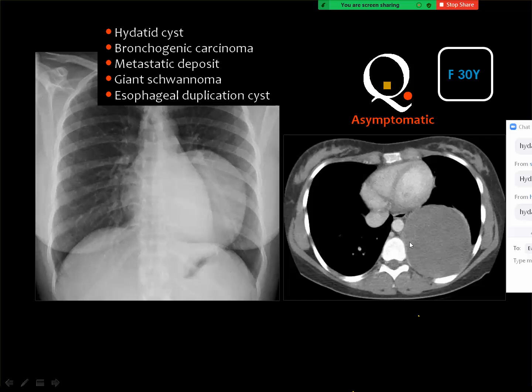But actually, you know that schwannomas are usually towards the density of cystic rather than the density of solid. And frequently, we introduce a fine needle to aspirate fluid from these lesions, but we fail. Then we introduce the true-cut needle, and we got a core biopsy.